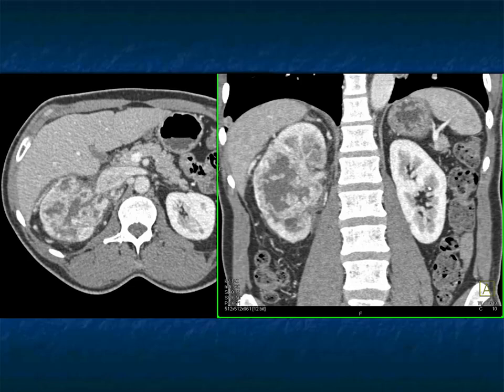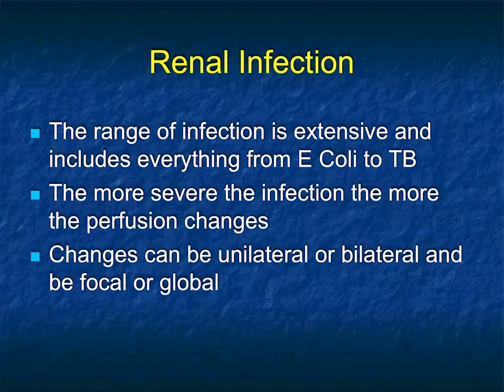And here's that same patient, the vascularity on the early phase imaging at 30 seconds, stranding and collaterals around the kidney, and the infiltration of the kidney by tumor, the changes in the corticomedullary interface nicely shown. Compare the tumor on the right with the normal kidney on the left.